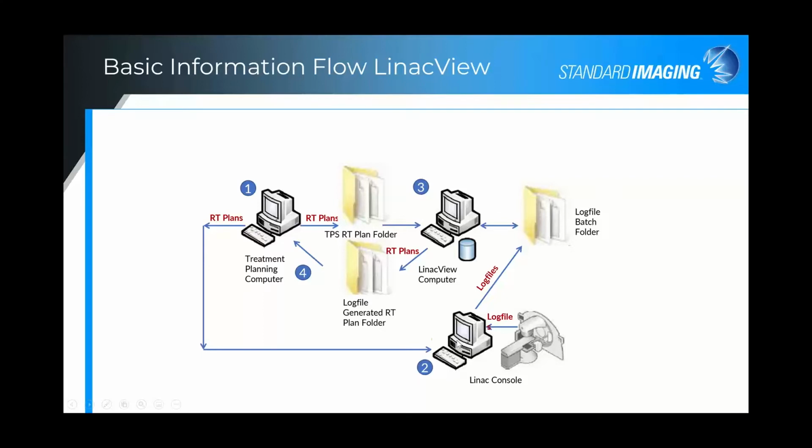Once the delivery occurs, log files are automatically synced into Linac View. The analysis occurs as it's syncing, and then we can analyze in Linac View.